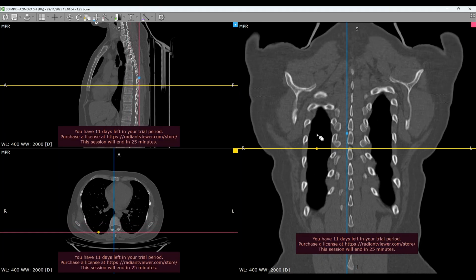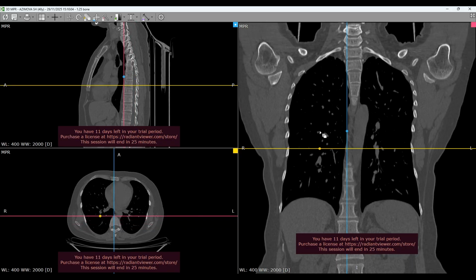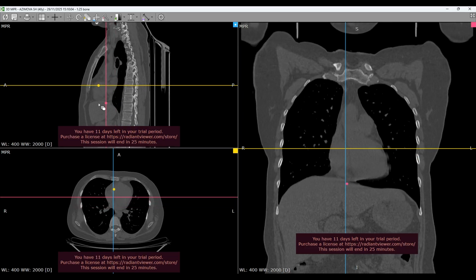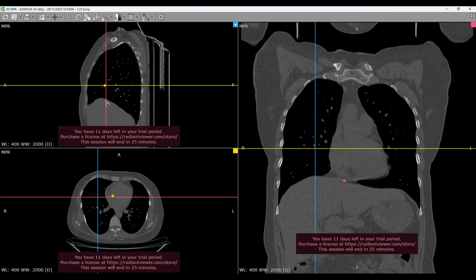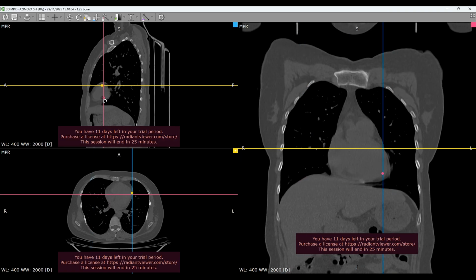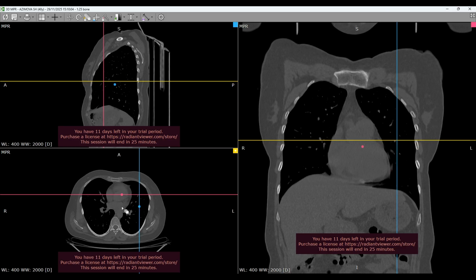The lungs display multiple branching airway structures, consistent with the normal distribution of bronchi and bronchioles. These branching patterns resemble a tree-like formation and are typical of healthy lung aeration patterns on CT imaging. The central airways, including the trachea and main bronchi, are also visible, positioned vertically in the midline before dividing into right and left bronchial passages.